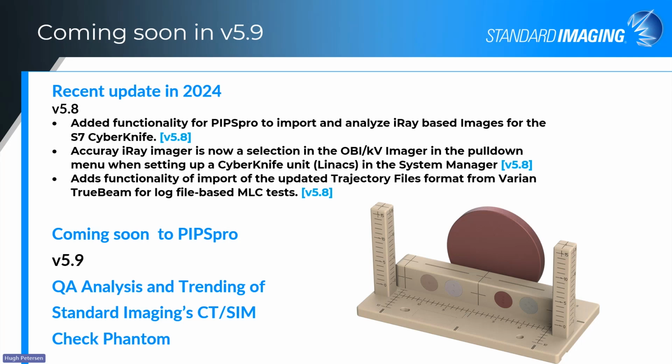And then coming soon: about 2 years ago, we purchased a Phantom company called IMT. They've got a number of different Phantoms, from stereotactic Phantoms to MR grid Phantoms to this one here, which is a CT SimCheck Phantom, which allows you to do not only mechanical but also imaging tests on the CT simulator. And we'll be adding QA analysis and trending to PIPSpro for this specific Phantom, and then more Phantoms down the road too. So we're constantly updating and adding to PIPSpro for future use.